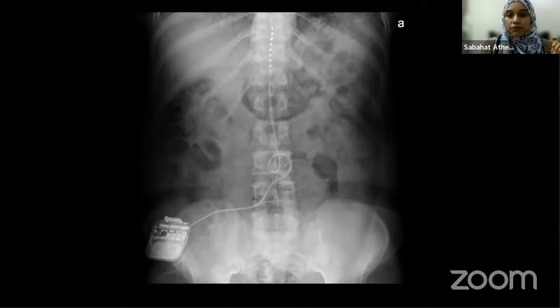So never forget the management. And always start with the lines and tubes. It's very important, especially in the exam setting, to be systematic. Otherwise, we would forget. Once you say that the tube is in the left lower lobe bronchus, say that I would pick up the phone, call the ICU, and then go to the rest of the case. Okay? Well done. Case number 2.